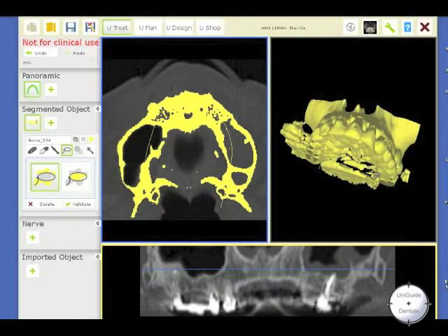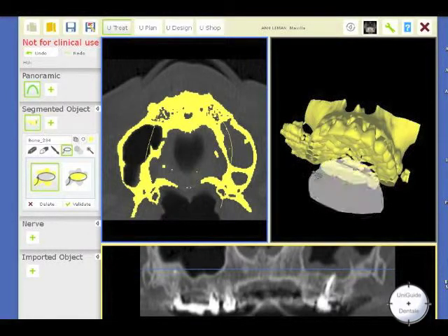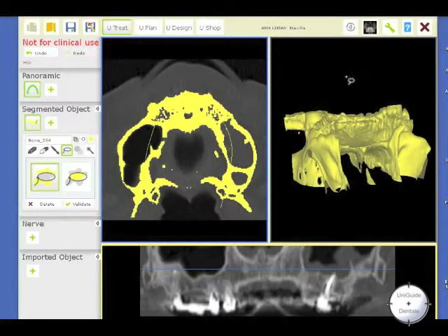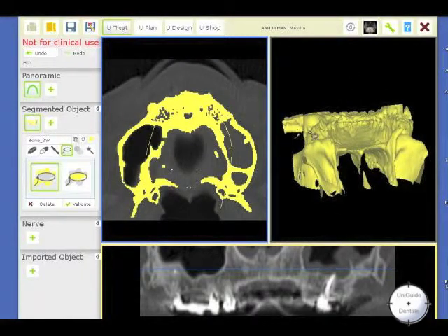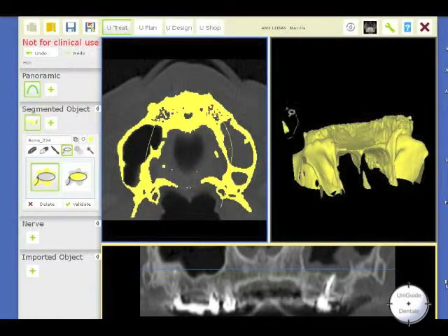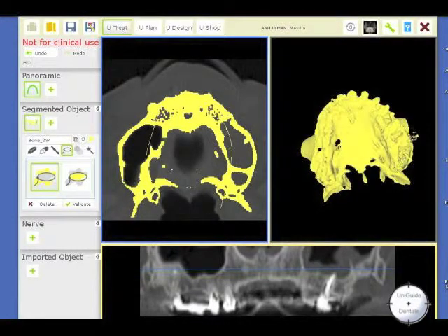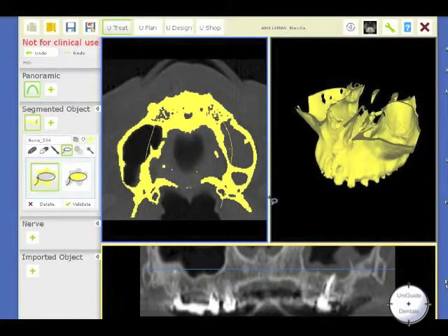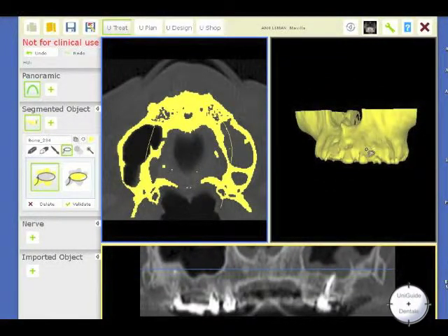I'm going to just remove what is here. I am going to remove all the rest, like this. And that's the image I'm going to start to rebuild with another mask. So I have been cleaning that in a very fast way, as you see.